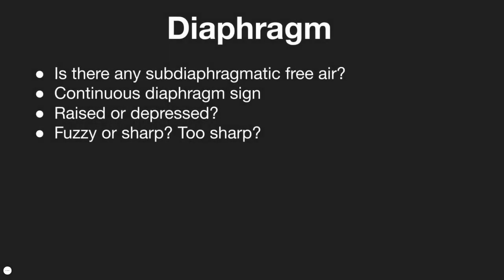Okay, move on to D for diaphragm. You need to trace the diaphragmatic contours and look above and below. For me, this is a reminder to check the visualized upper abdomen for free air and dilated bowel. It's also another chance to look above the diaphragm for basal consolidation or subtle pleural effusion.